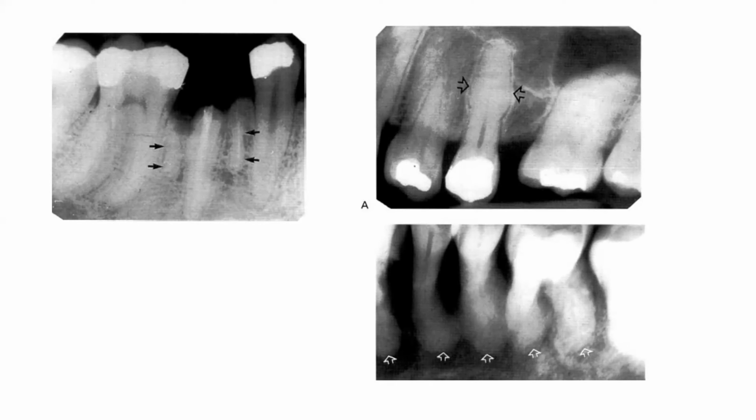We also have cementoses. So hypercementosis, which we see on the radiographs to the right, basically presents as formation of excessive amounts of cementum, usually around the apical portion of the root. The cause is unknown, but it is sometimes seen in Paget's disease of bone and is typically craggy and irregular. Diagnostically, hypercementosis is not a problem, the resultant opacity being part of the tooth root and producing an alteration to the root outline. We can see it on the teeth with the arrows on the x-rays.